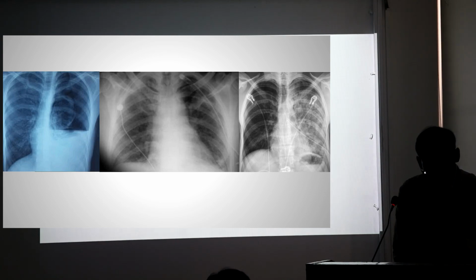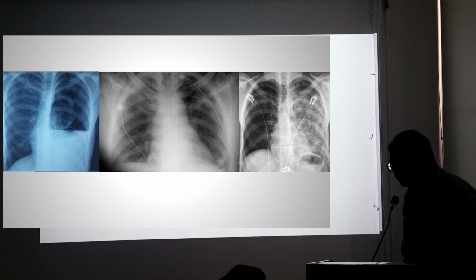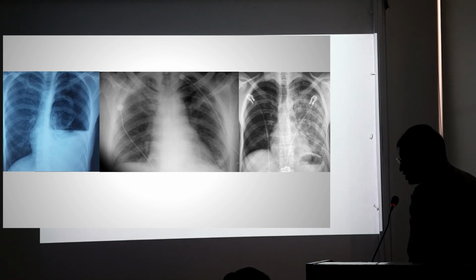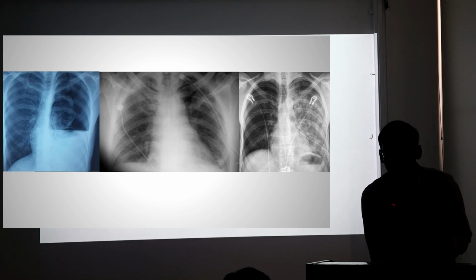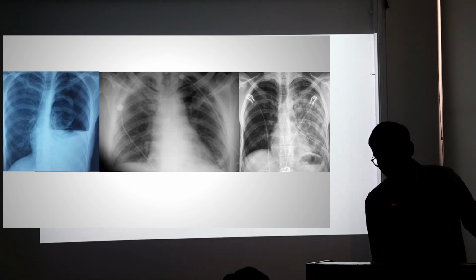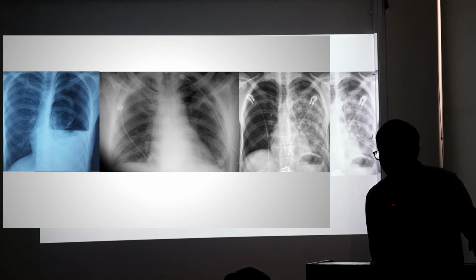So coming to the next topic, what can one see over here? I've already discussed hydropneumothorax. What would you like to do? ICD. So we have done ICD. Okay. So this is like half an hour after ICD. After putting in ICD, patient saturation is dropping. Would you like to repeat an X-ray? Okay, we repeated an X-ray.